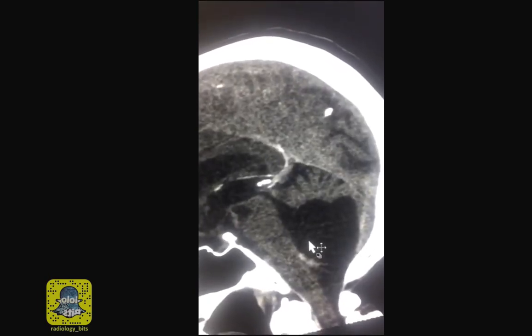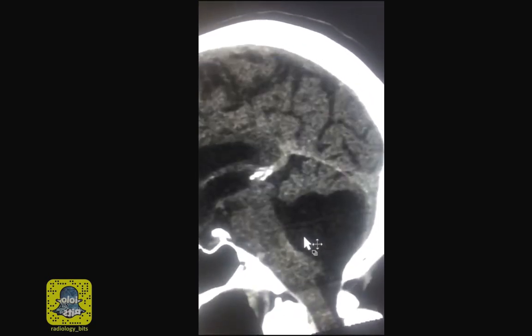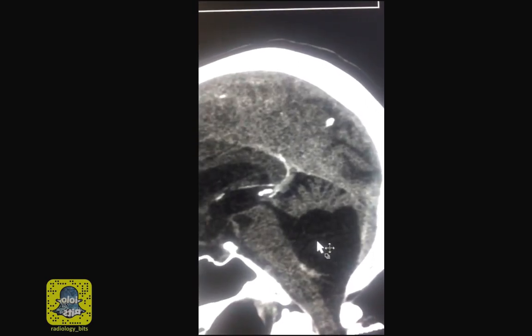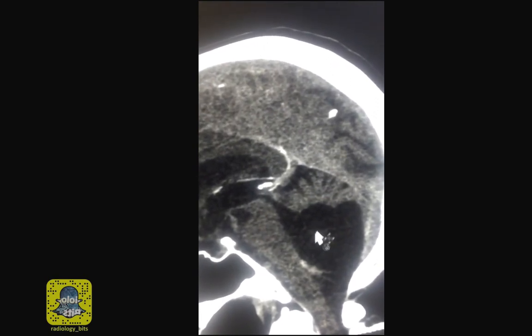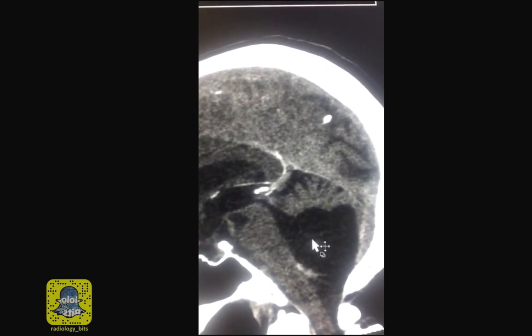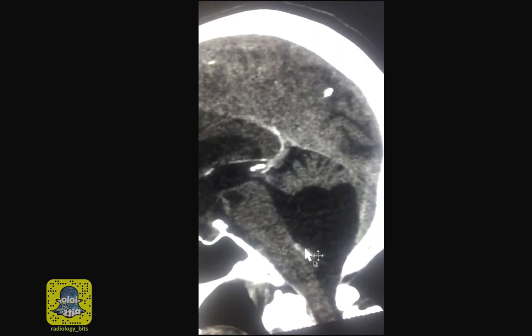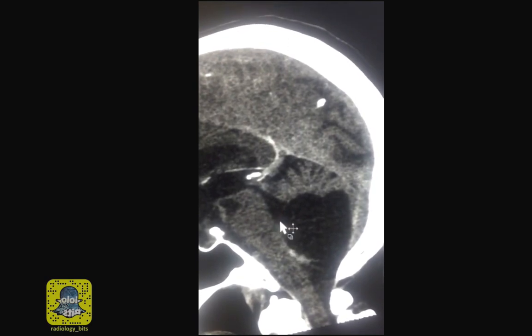Another lesion that may simulate a cyst in density is an epidermoid cyst. Sometimes with an epidermoid cyst, you might notice that the fluid is a bit more complex than your typical CSF. Although that's sometimes difficult on a CT scan, it would be much easier to appreciate on an MRI. One of the things that you could do to make sure that there is no abnormal enhancement is to do an MRI with intravenous contrast. The reason you might want to do that is because some posterior fossa neoplasms may have a cystic component. And whatever differential diagnosis we talked about just a moment ago should not show you enhancing components at all.